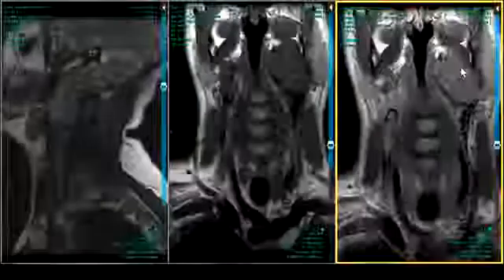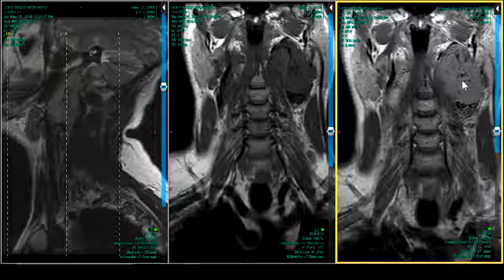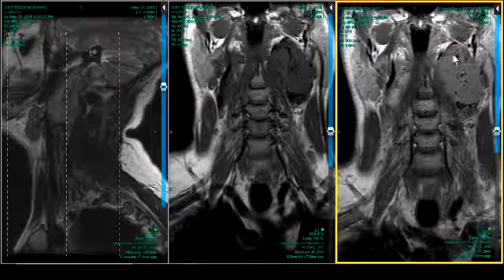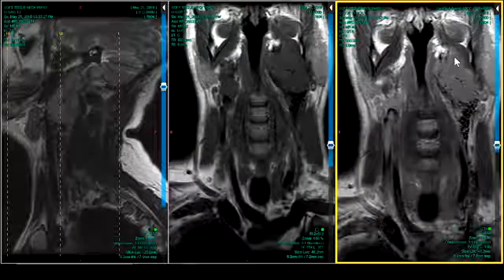Siderosis you would consider, but that's going to be almost salt and pepper uniformly stippled. Now you can get very salt and pepper-like looks to paragangliomas because the vessels are so small if you cut them in cross-section, but if you catch them in plane, they're going to be more linear. And that looks a little peppery right there, a little salt and pepper, and then it looks a little linear over there. What else might give you low signal?